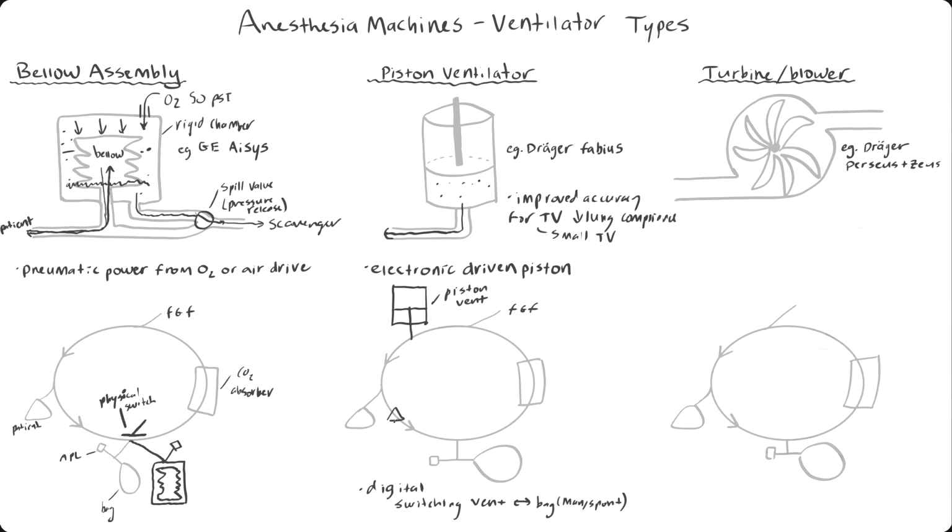Some other components of this circuit are this pressure max and PEEP regulator. And you don't have to know this, but this is interesting. There's this device called the fresh gas flow decoupler, which prevents the fresh gas flow from contributing to the volume that's delivered to the patient. Remember, we said that this vent is very accurate at delivering certain tidal volumes. So when this vent is delivering the air to the patient, it prevents the extra flow from your fresh gas flow from adding a little bit more to this tidal volume.